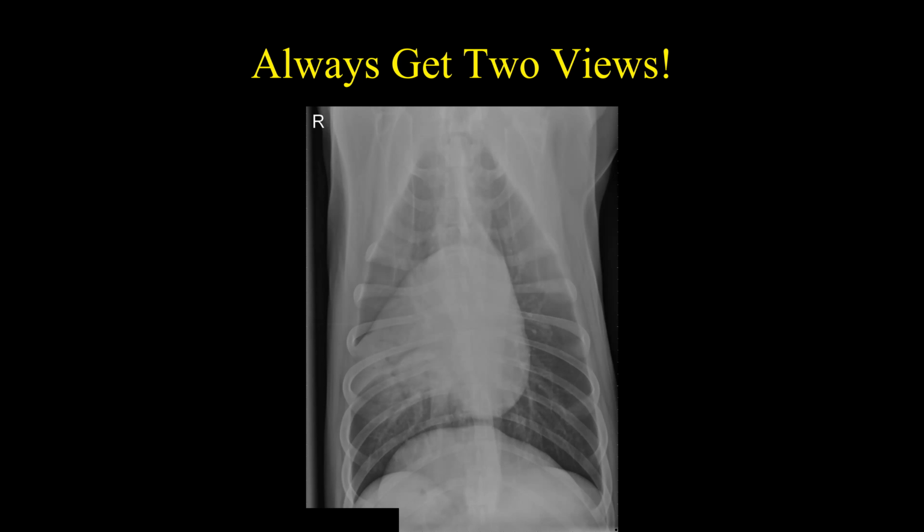So just keep in mind that on lateral views, you see the up lung best. Typically that's what you see. And so, bottom line, this is where you have to be on your feet and think, when you're out on your own and in practice.